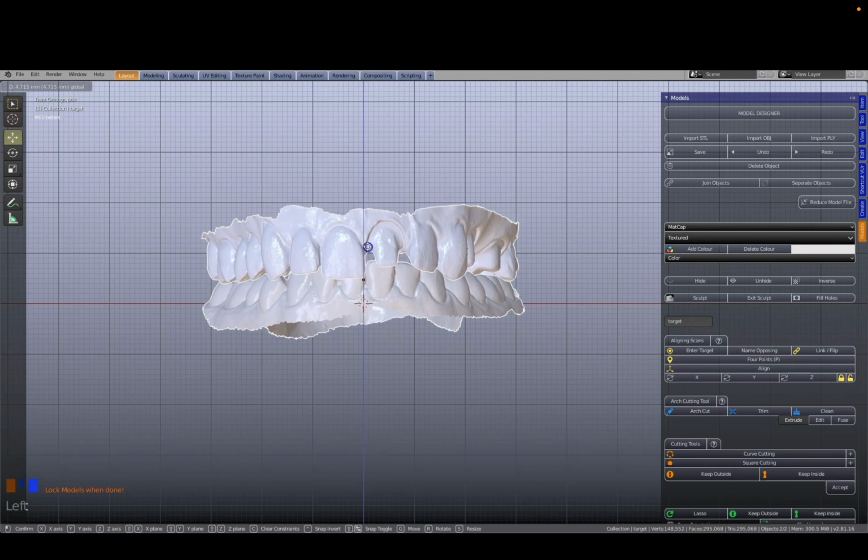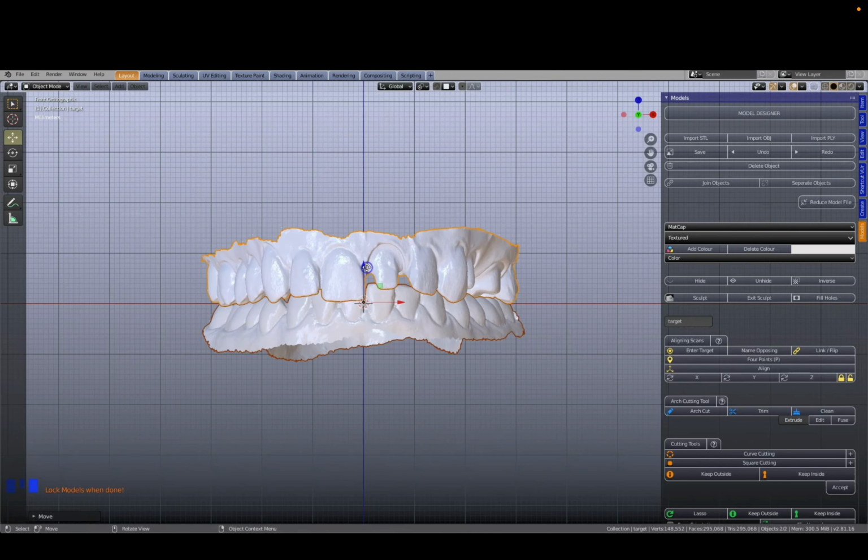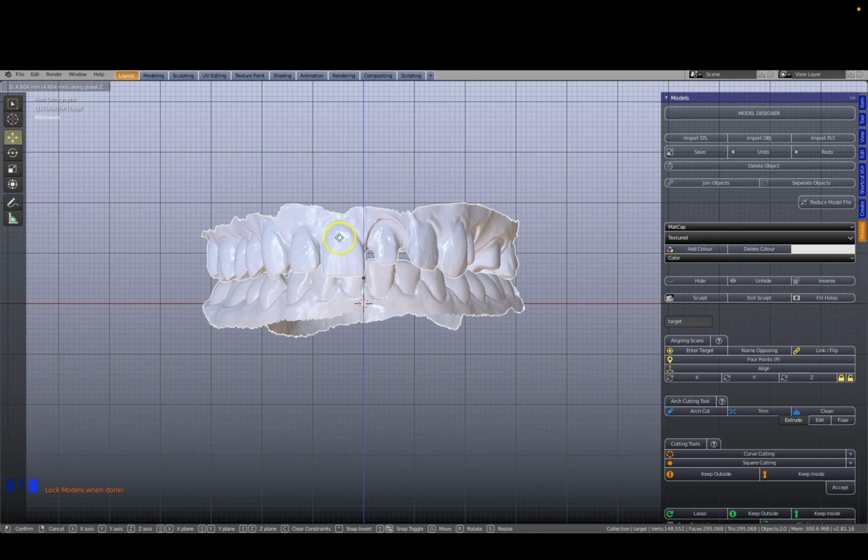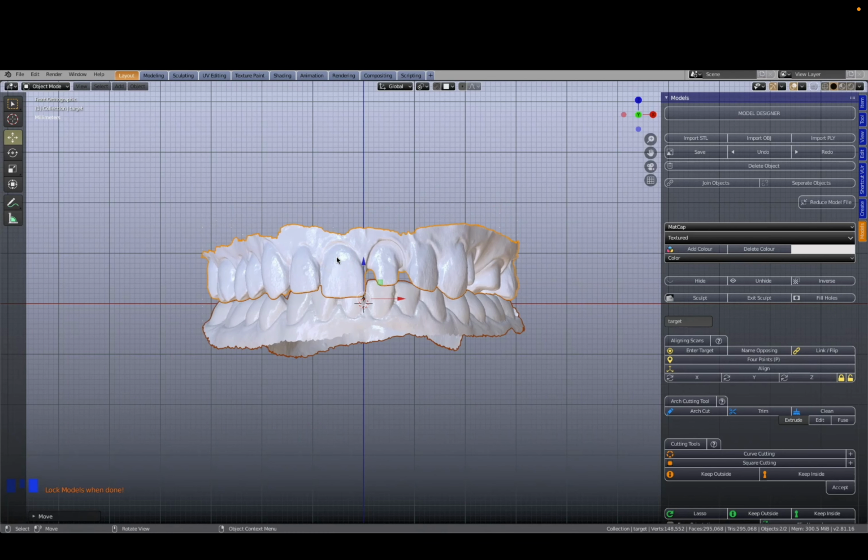If you press on the 3D viewport, you will lose the selection of both objects. If this happens, simply double-select them again. If you would like to use shortcut keys, first press the letter G, followed by the letter Z. This means you are grabbing the object into the Z direction.